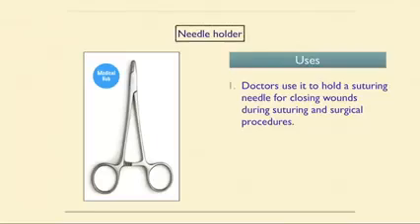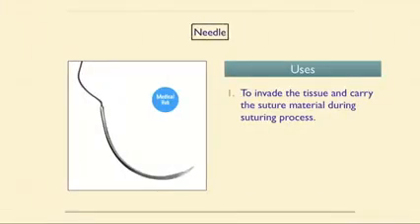Our next instrument is needle holder. Doctor use it to hold a suturing needle for closing wounds during suturing and surgical procedures. Next instrument is needle. Used it to invade the tissue and carry the suture material during suturing process.